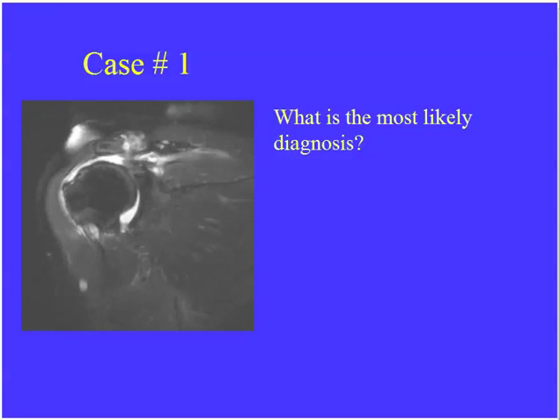Okay, so this is the classic question they'll ask. They'll show you this picture and ask what the diagnosis is, and you'll have a list of 4 or 5 things to choose from. Here we see the supraspinatus muscle. The musculotendinous junction is markedly retracted. Here's the tendon coming across. Should be coming all the way across to the greater tuberosity, but we see it stop here, and we see high signal fluid in the expected location, and this represents a rotator cuff tear.